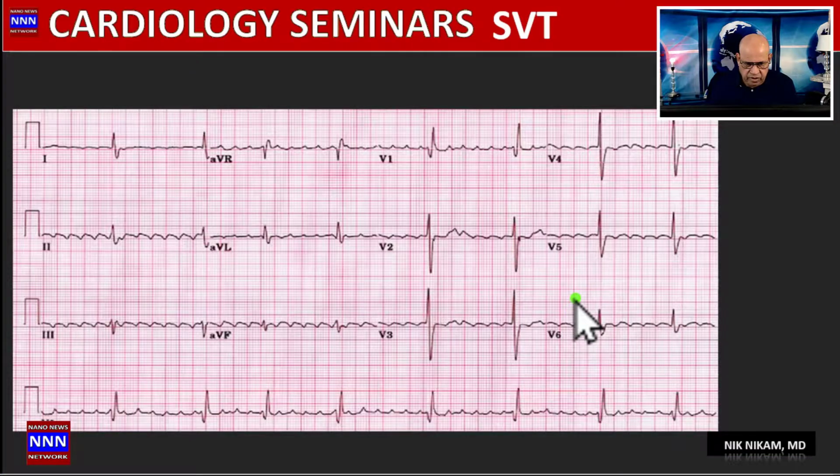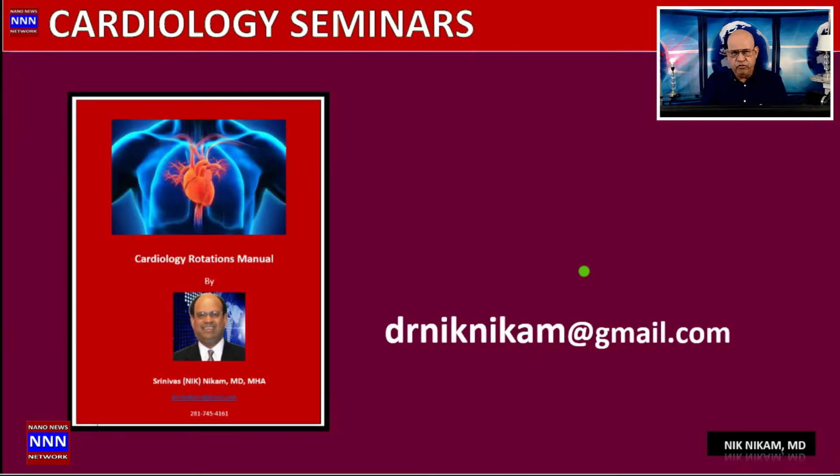Here's an example of a slow ventricular response, but we have an arrhythmia. Can you identify the arrhythmia? Well, this is atrial flutter at a rate of 300 per minute with a very slow ventricular response. Whenever you see atrial flutter with a very slow ventricular response, you need to be thinking about, is this related to drugs like beta blockers or digoxin? Is this related to sick sinus syndrome? Or is this related to any other underlying condition? And these patients may end up needing a pacemaker because if they have a very severe bradycardia which is symptomatic, they need help.